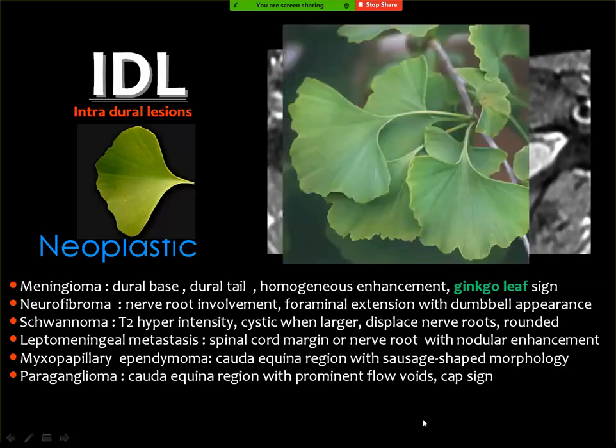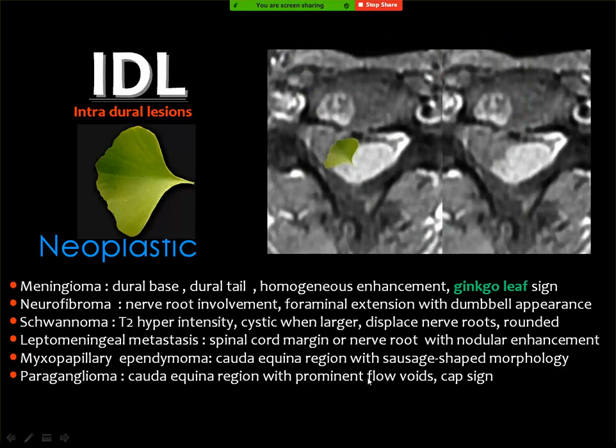Then it is written in the literature that, in order to diagnose meningioma, one of the helpful signs is this appearance, which is known as the ginkgo leaf.